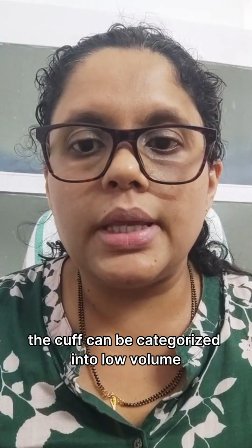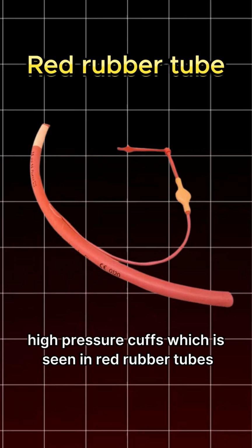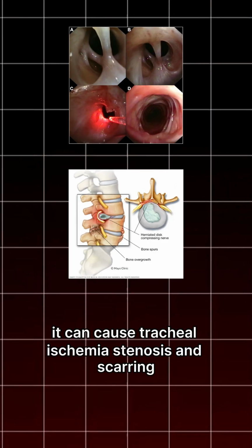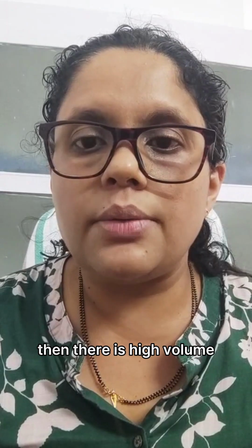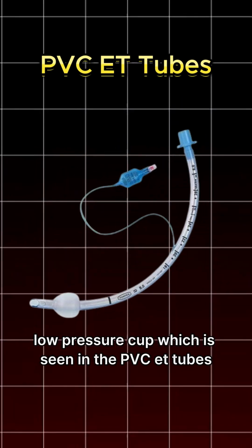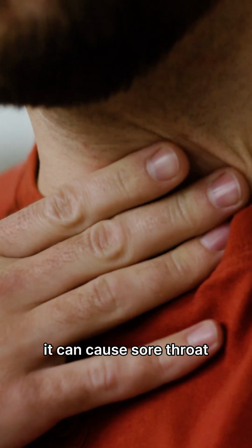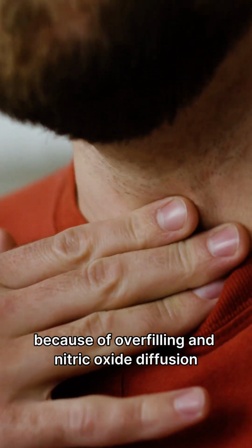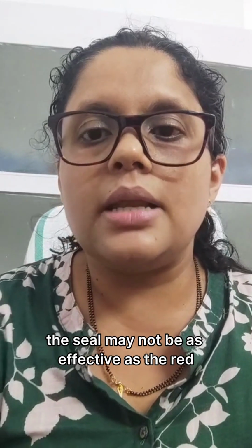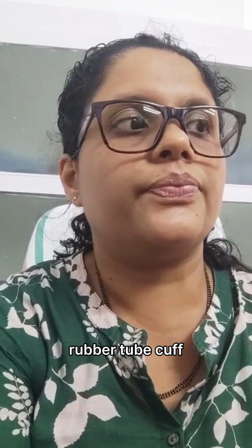The cuff can be categorized into low volume, high pressure cuffs, which are seen in red rubber tubes. They can cause tracheal ischemia, stenosis, and scarring. Then there is the high volume, low pressure cuff, which is seen in PVC ET tubes. It has a larger resting volume and diameter. It can cause sore throat because of overfilling and nitrous oxide diffusion. The seal may not be as effective as the red rubber tube cuff.